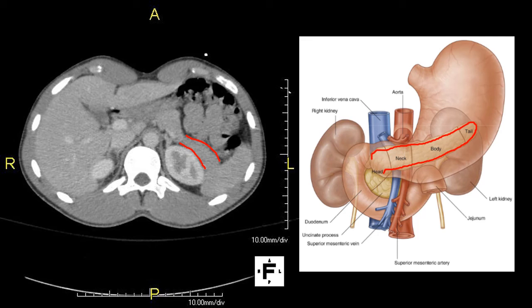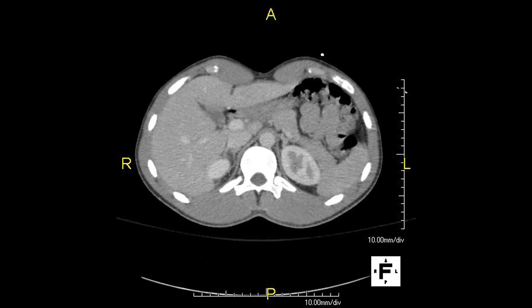Notice how close in proximity the pancreas is to the left kidney and the spleen. And just keep in mind the spleen isn't shown on our cartoon image on the right. This is the same image we have looked at in the past 2 slides. There are 2 things I want you to keep an eye on now as we move through a couple more images. The first of which being this little dark gray structure close to the liver. And I'll outline that quickly in blue for you.